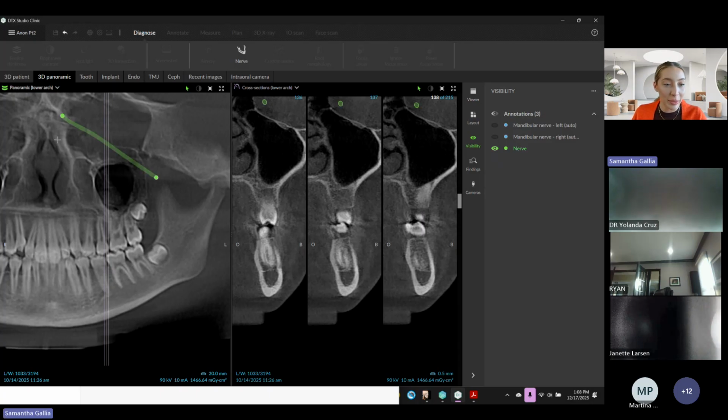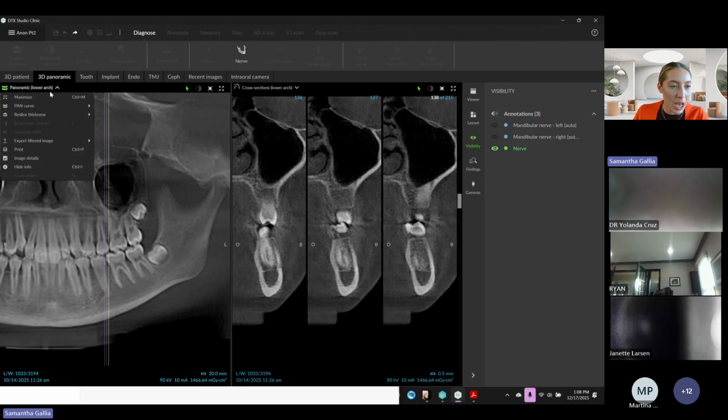Oops. All right, well, that was a good example of if you ever do anything you don't like, you just come up here to the top and we hit undo. You can always undo it. So I'm going to undo both of those because I didn't mean to.